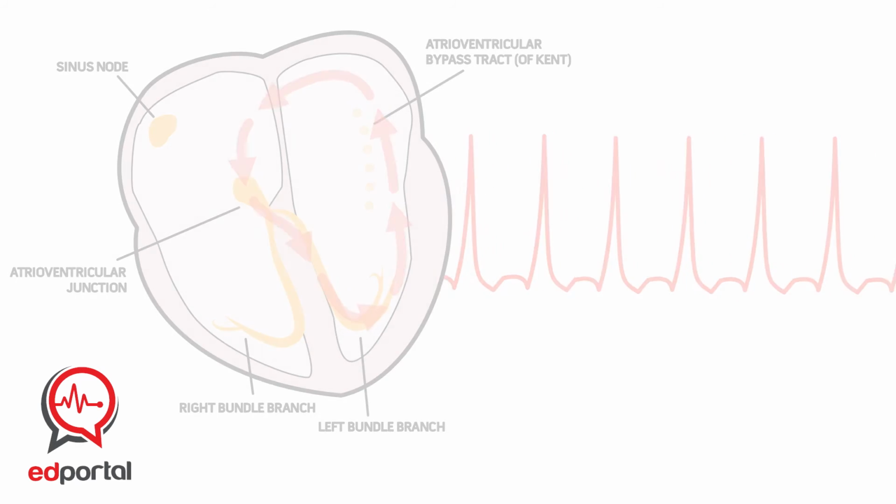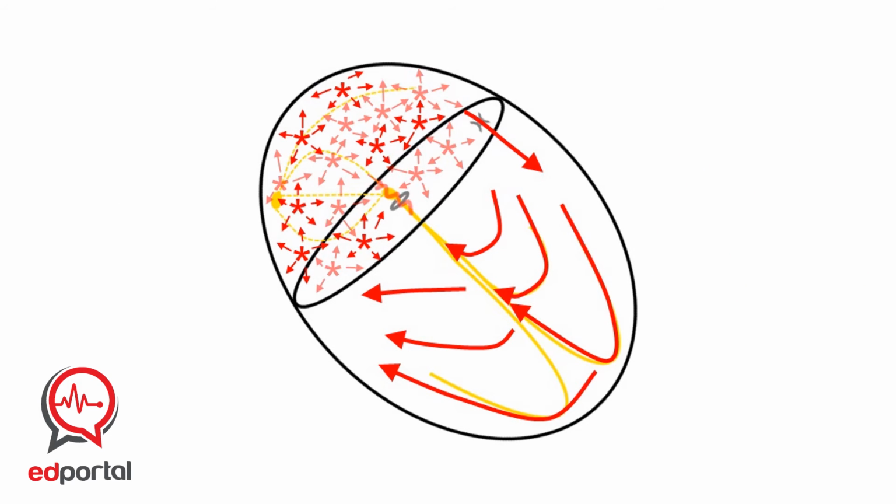So the third diagram shows what happens if the patient suddenly goes into AF. For example, our patient was initially in sinus rhythm and then he went suddenly into AF. In AF, the atria are beating at 300 to 600. Now we have the accessory pathway and the conduction will come through. When the conduction comes through the accessory pathway, there's nothing to kill the beats like the AV node. So most of the conduction will go through the accessory pathway, and you will still have the AV node to kill some of the beats.